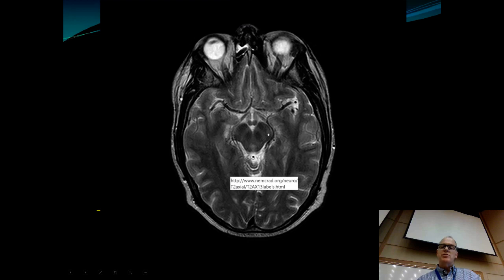Okay, and now we can see the midbrain, not just the cerebral peduncles, but if you can see there's a little lighter white area there, that's the substantia nigra. The red nucleus. Okay, why is the red nucleus dark? Well, since other neurons here appear white, the decussation of the superior cerebellar peduncle is also right in that area. That's a pathway. It's going to look dark on an MRI scan. So we're looking at a couple of different things here. Again, there's the cerebral aqueduct, and we can see the superior colliculi right back here. Okay, just a little bit of the top of the vermis of the cerebellum, but most of this back here then is occipital lobe, and we can follow the pathways, the optic radiations, on their way back here to the occipital lobe.